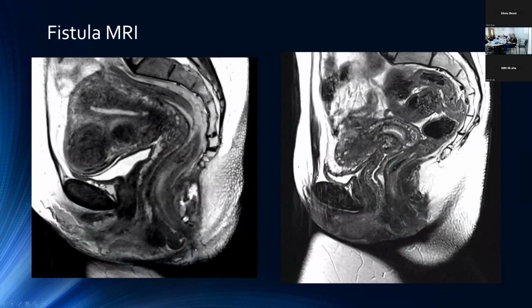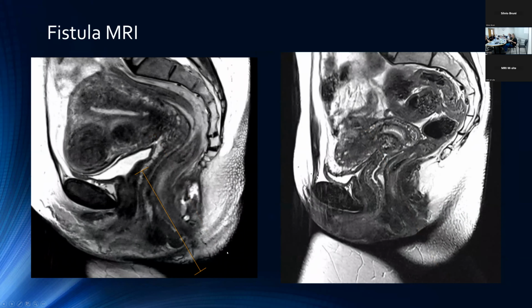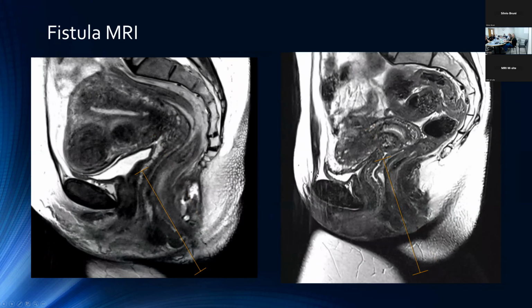And just a couple of final quick cases here. In this case, the anal canal is slightly curved, and again, you do your best to approximate a tangent to that curvature, extending as discussed from above through the inferior fold. And same thing here, a little bit more thickened and irregular inferior anal canal, but again, quite easy to make out that long axis of the anal canal in these cases.